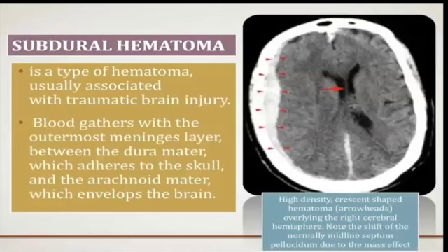Now, the subdural hematoma, on the other hand, is going to give you this more crescent or banana shape that we see here on the periphery. Now, please note it's not as white as the bones, okay? It is not as white as the bones. The crescent shape that we're looking at for the subdural hematoma is the classical picture whenever we're looking at a subdural hematoma.